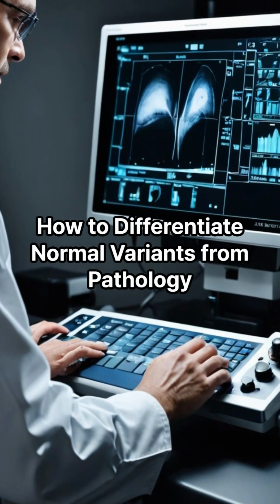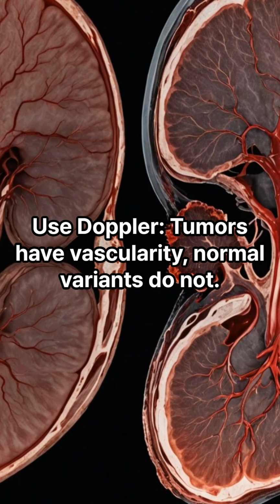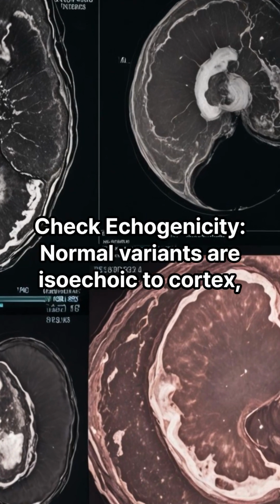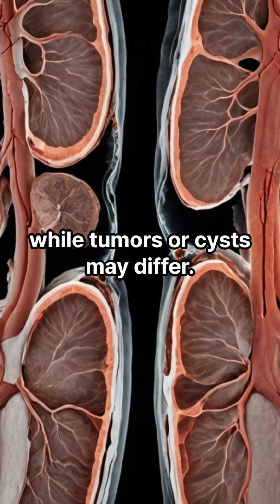How to differentiate normal variants from pathology. Use Doppler: tumors have vascularity, normal variants do not. Check echogenicity. Normal variants are isoechoic to cortex, while tumors or cysts may differ.